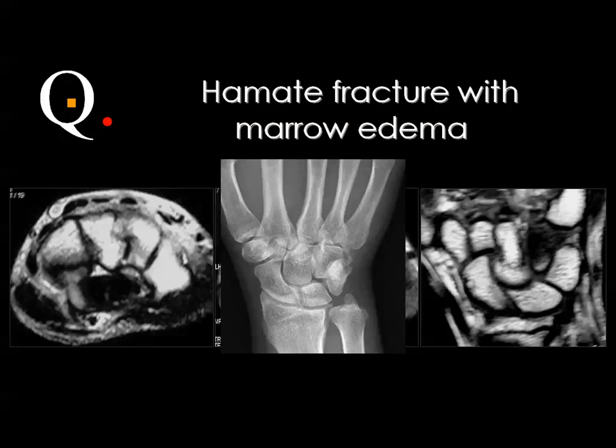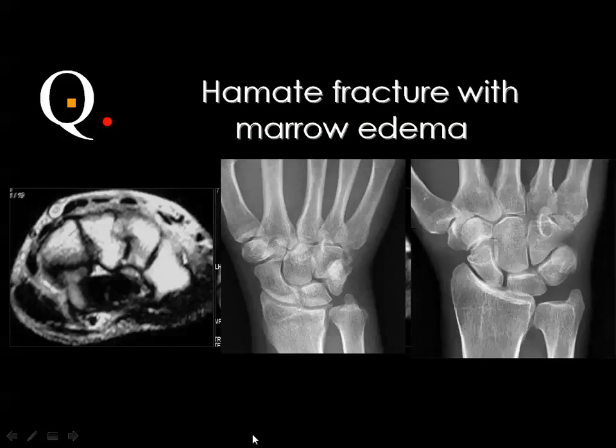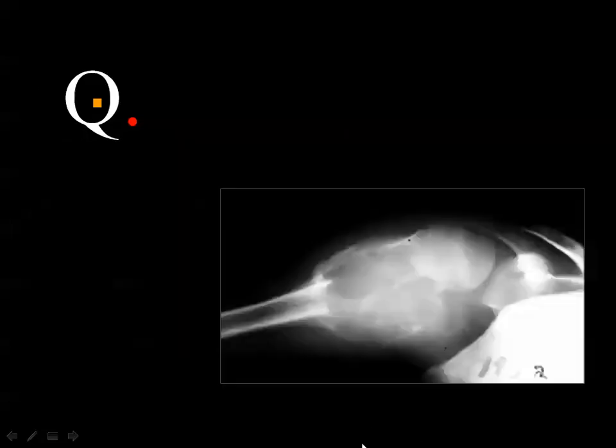طبعا في البلين اكس راي بتعرف الهوك اوف هامات فراكشر من علامة جبارة جدا. عارفينها؟ طيب في حاجة اسمها the eye of hamate، دي الهامات ودي العين بتاعتها. Whenever you lose the eye of hamate تعرف إن الهوك بتاعتها مكسورة. دي واحدة من الساينز القوية جدا في البلين اكس راي. Whenever you are not able to identify the eye of the hamate, then you know that the hook of the hamate is fractured. Okay. X-ray of the right shoulder.